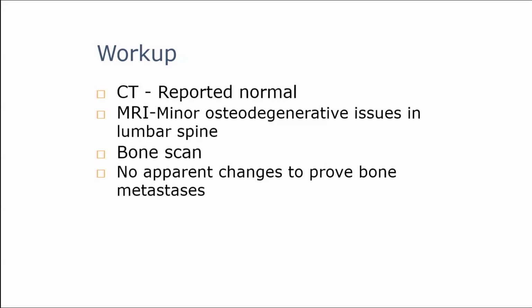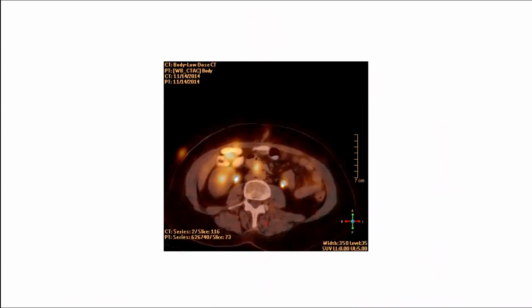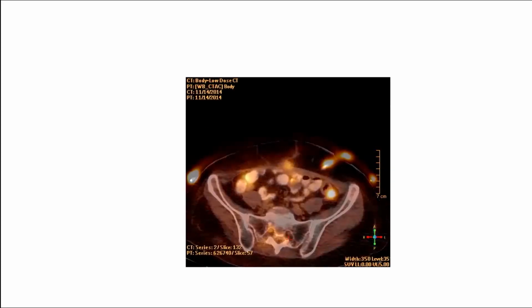But what we expect here: no tumor masses, no bone destruction, nothing on conventional imaging. What we expect here is perineural spread, which is invisible on conventional imaging and badly read on MRI. This is the patient. She also had cystectomy during her operation, so these are the stomas. Nothing so striking. Well, she has para-aortic lymph nodes that we expect to be there. She has a peritoneal metastasis, which is also expected.